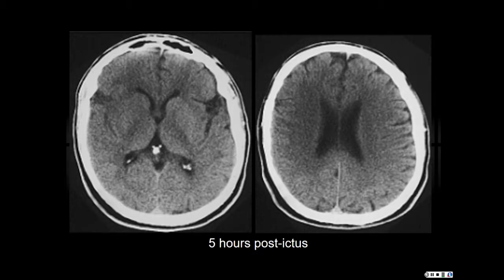You want me to guide you? Is the ventricular system normal? Is there any shift to the midline or mass effect? No. Are there any extra-axial fluid collections? No. Okay. Great. Now, what did we talk about before in areas of acute ischemia in terms of edema and blurring of the gray-white matter junction? On the first image on the right, there's a little bit more. Like right there. Yes, you're exactly right.